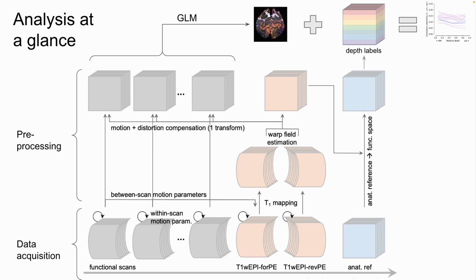Anyway, here's what I'm doing. I've got my functional scans. I've got these T1 weighted scans that I'll show you that really help me know where I'm at. And then I've got some kind of anatomical reference. I actually have 2 anatomical references. In this scanning session, I acquire one that I use as a go-between for a different 3T acquired MP Rage. It's like the 1990s called and they want their data back.